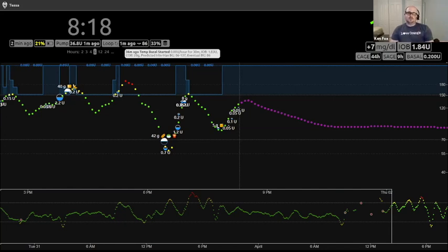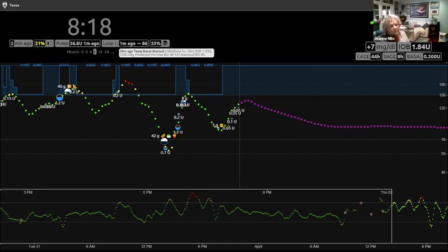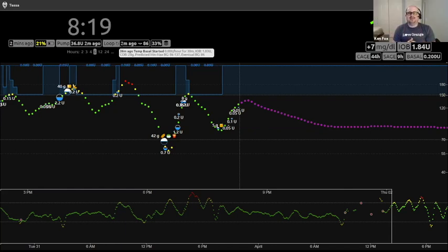The loop pill, this little icon, will tell you what's going on. That circle with the arrow you're seeing right now means everything's working great. Why do you call it a pill? That's a good question, because it kind of looks like a Dr. Mario pill. It's what I think of. It's not an uncommon term in web development or app development in general. We have little boxes of information. I don't know why that term stuck, but it's not unique to Nightscout. You probably won't be playing around with other applications and talking about the pills you see, but that's okay.